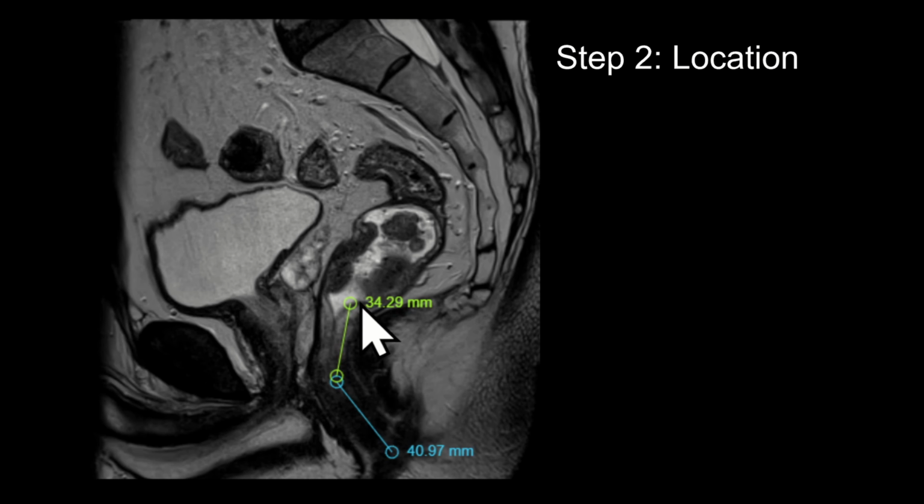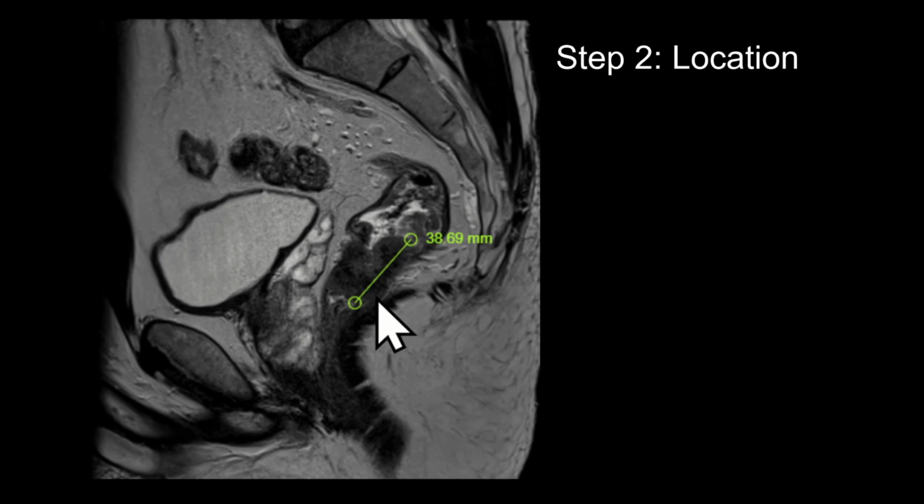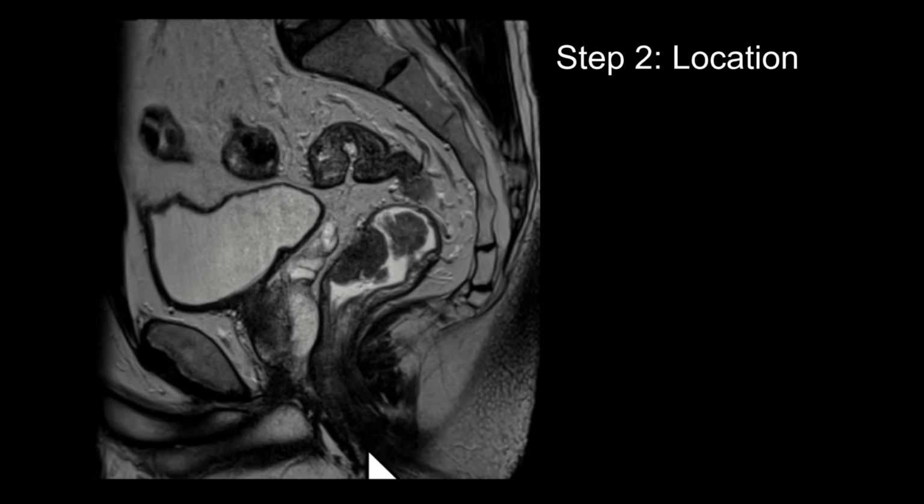We also want to mention the distance from the tumor to the anorectal junction, which has surgical implications, especially for lower tumors, as well as the height of the tumor. So this one is about 3.8 centimeters in height. As a brief side point, anal cancer, which arises from the anal canal and is squamous cell carcinoma, is staged very differently than rectal cancer. So one, for low tumors that involve the anal canal, make sure that you consult the notes and know if you're dealing with a rectal cancer or an anal cancer. And two, here we are talking about rectal cancer staging. In our online course, we cover how to stage anal cancers as well.